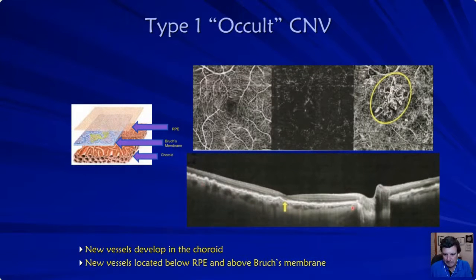Take a look at this B scan that's down here. This is just really sick RPE. You can see the intermediate to large drusen. You can see these hyper-reflective columns. You look at the RPE. The vision in this eye is really good.